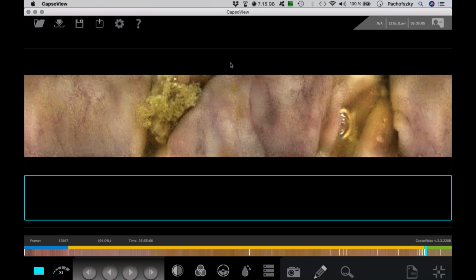If you imagine the capsule, we have 4 cameras around the capsule, and the software is wrapping this up, and we have here in this area, from here to the left, the first camera, then is arranged the picture of the second, then the third, and the last one.